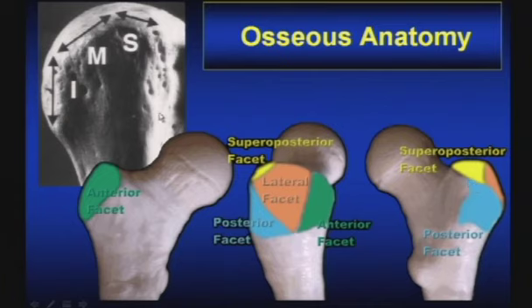So let's look at this humerus in internal rotation. Lesser tuberosity off the image. Intertubercular sulcus shown here, greater tuberosity, pretty big structure, a lot of real estate there. As we move from anterior to posterior, we're going to see changes in contour of that greater tuberosity. Horizontal facet correlating with the supraspinatus attachment, the middle or oblique facet correlating with the supra and infraspinatus attachment sites, and the inferior or vertical facet that correlates with the attachment site of the teres minor.